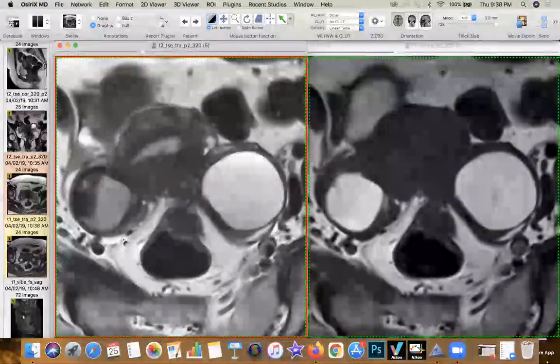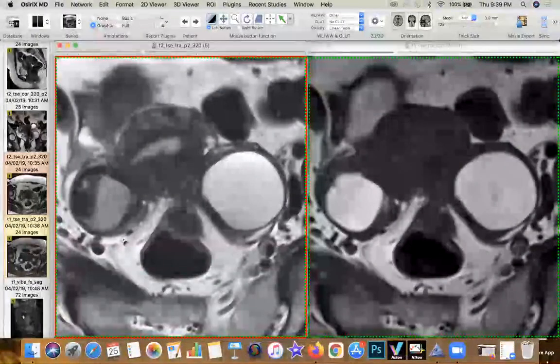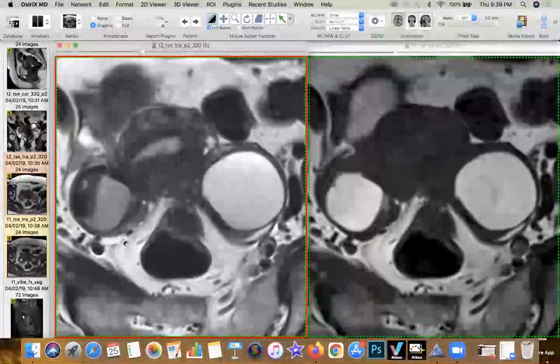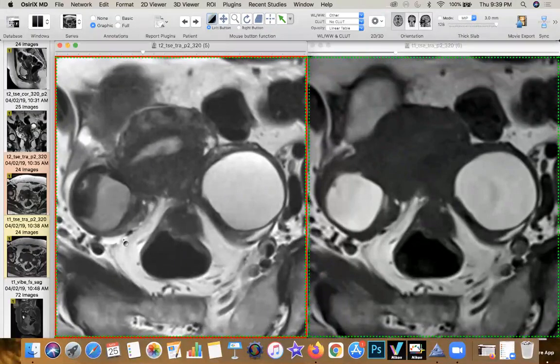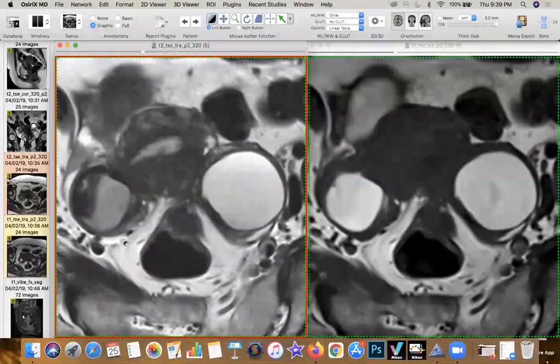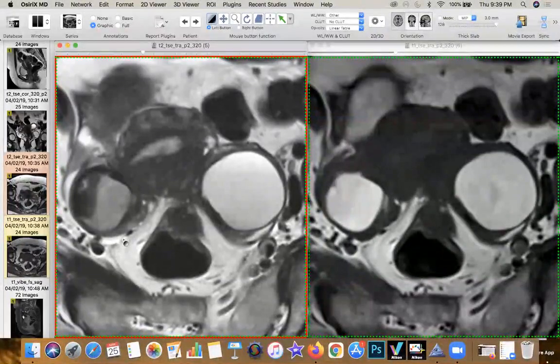So when you have a hemorrhagic lesion in the ovary, the first differential is, of course, it could be a simple hemorrhagic cyst. Of course, the differential diagnosis is going to be an endometrioma. Less likely, very rarely, you've got to remember endometrioid carcinoma of the ovary. That's one differential which you should always keep in mind, which can occur in these patients itself, and they can also show a T2 shading effect. Now, this T2 shading effect does not affect every endometrioma. So you don't expect T2 shading effect to be seen in all cases. It is only seen in a minuscule number of patients.